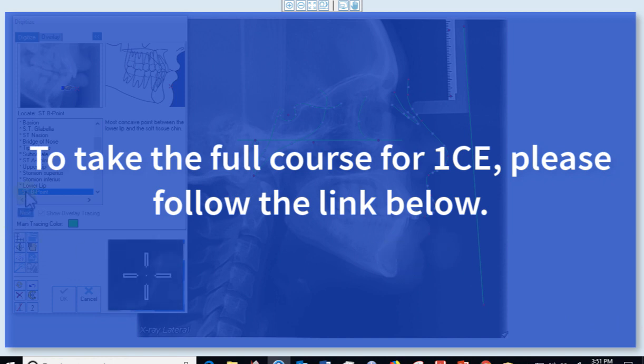And then your next point is your soft tissue B point. B point is the deepest curvature of the mandible, and a soft tissue B point will be just anterior to that. So that's your soft tissue B point. Soft tissue pogonion, that's the anterior curve of the soft tissue of the chin. Okay, so it's right there. And then we're going to have the soft tissue gnathion. It's the most anterior and inferior point of the soft tissue chin in the mid-sagittal plane. So it's about right there.